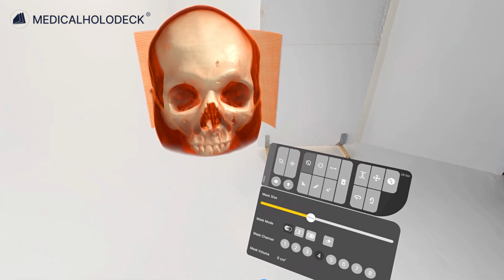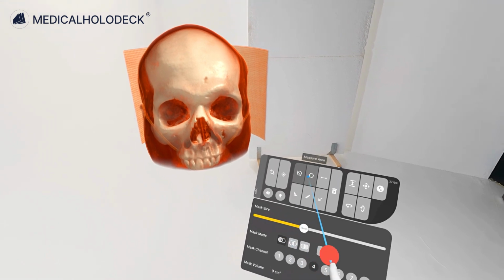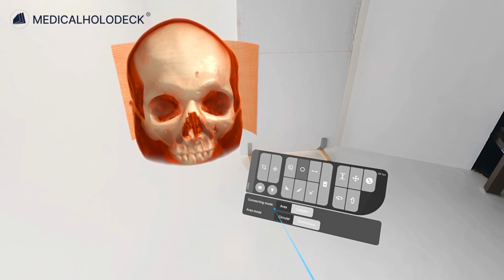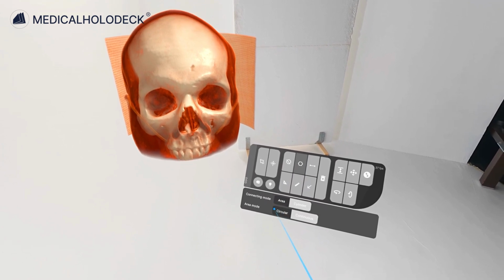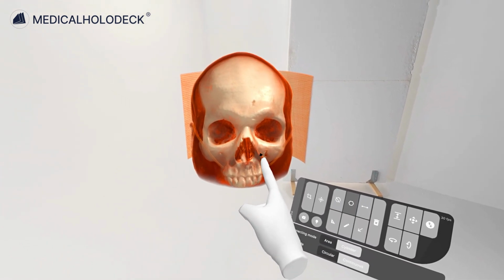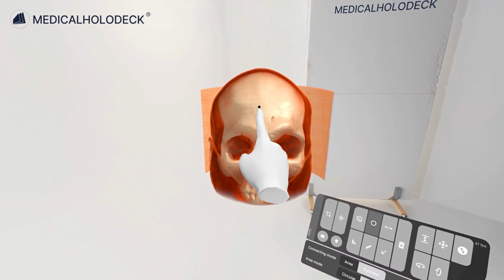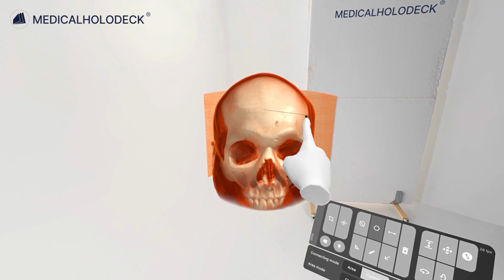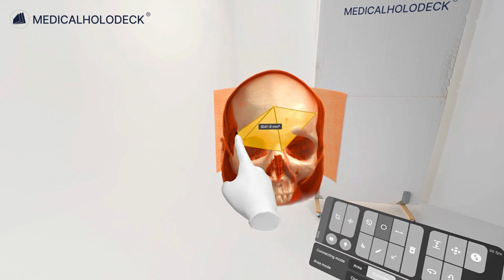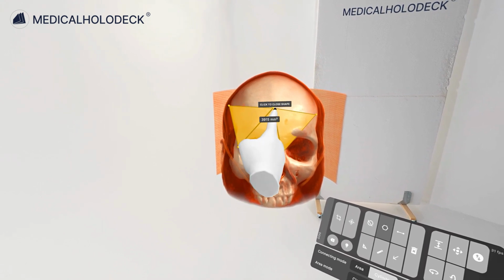To measure surface area, select the area measuring tool from the object pad. A black cone will appear at the controller's fingertip. While in the area connecting mode, use the additional panel to switch between area types. In the circular mode, use the trigger to place the center point. Each new point will connect to both the center and the previously placed point, forming a shape around the center.